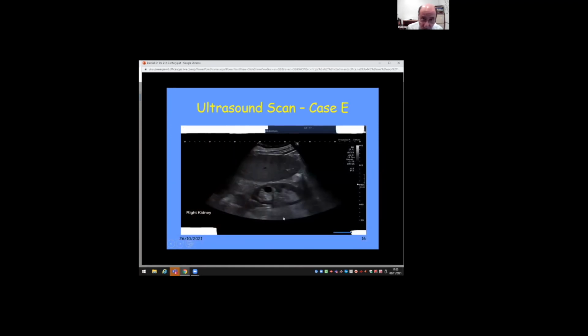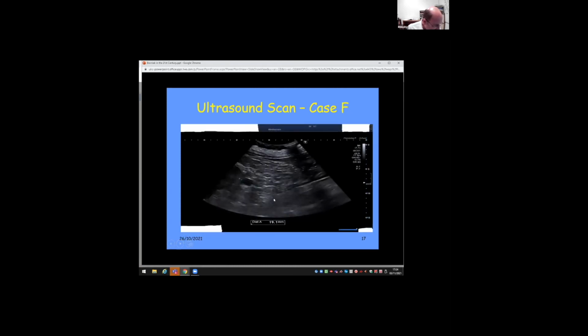Now, these next two are hyperdense cysts seen on CT, where they sent us to ultrasound because it's well known that a cyst can be hyperdense and yet simple. And here you go, that's simple. Here's another case, and of course, that's simple as well. So this is where we have changed the diagnosis again. Although this is not changing it, they knew what they were doing here.